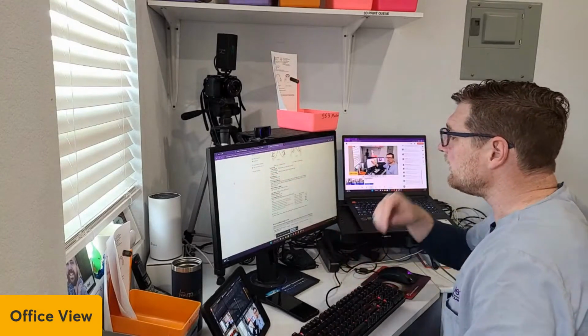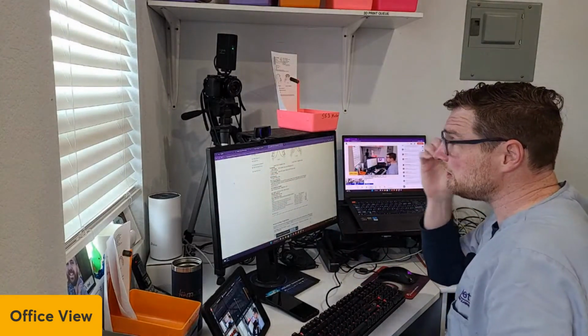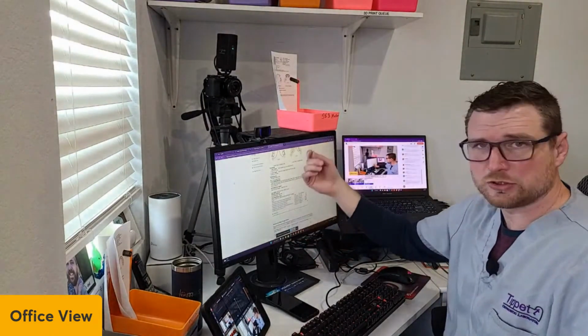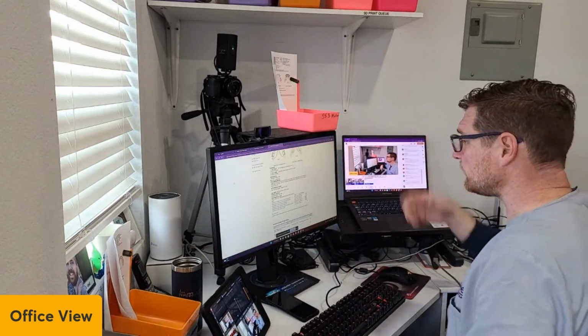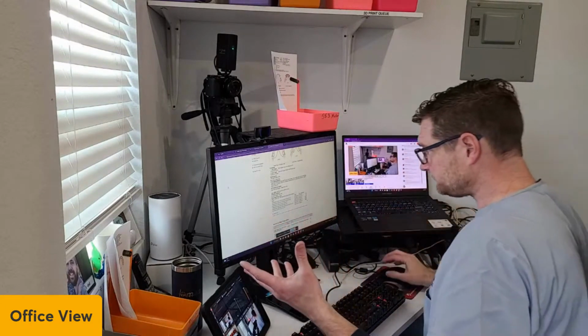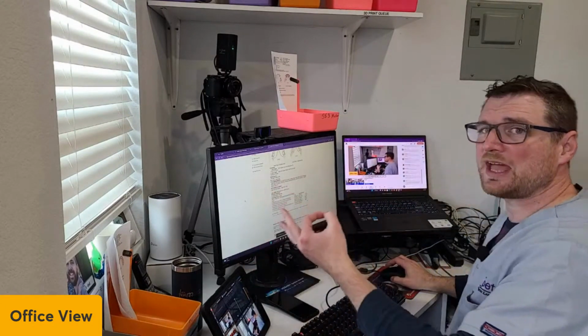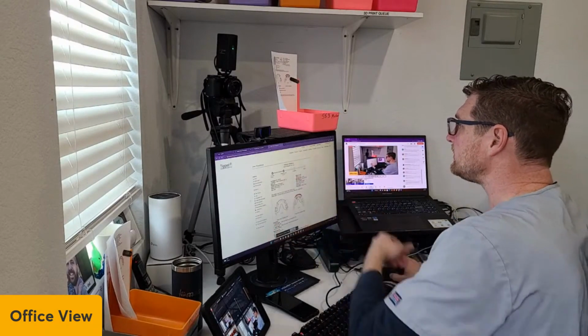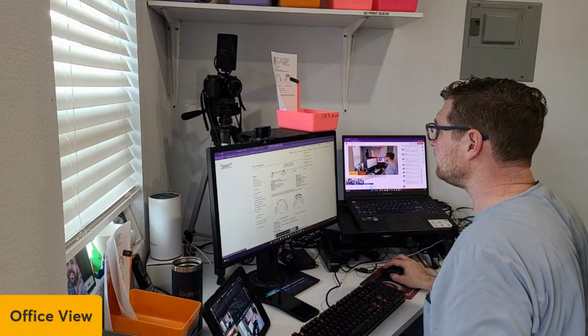And whenever I used to do all these by hand, I would do the lower first, and then I would do the upper. So I always knew that hollow was lower, hollow -1 was the upper. So if I was looking for that, that's where we would be. So now I can go back to that EasyRx print list up here. Let's go there, print list.